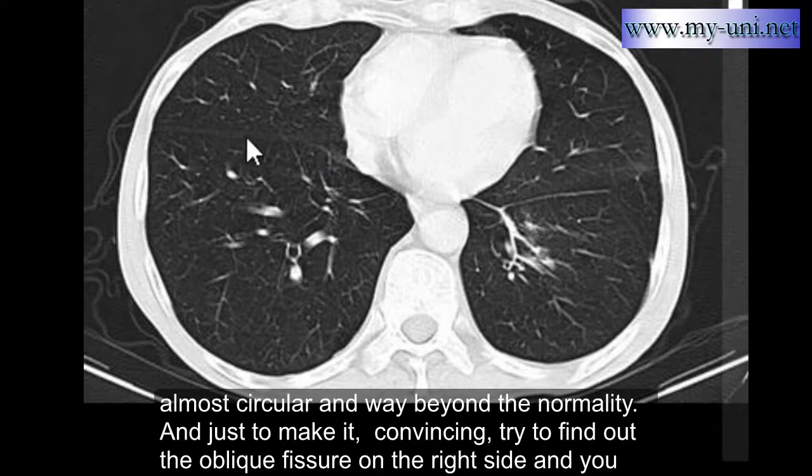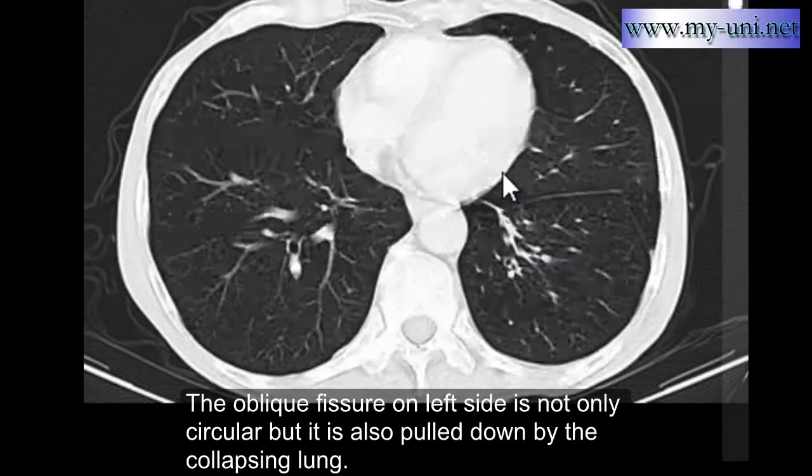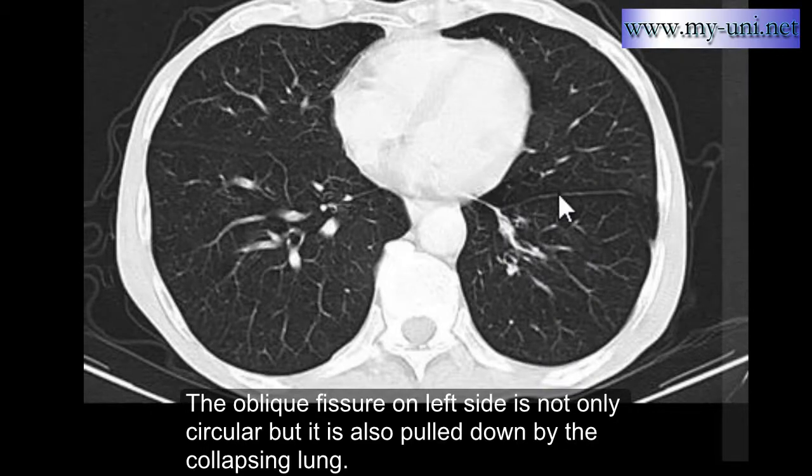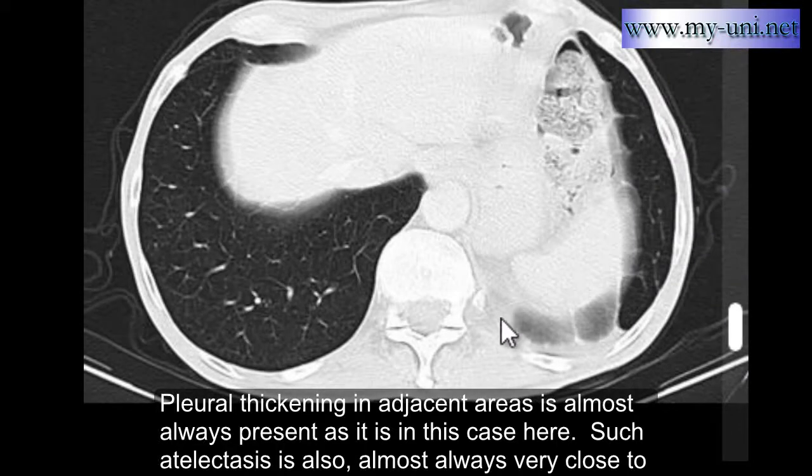You can see that it is higher up. The oblique fissure on the left side is not only circular, but it is also pulled down by the collapsing lung. Pleural thickening in adjacent areas is almost always present, as it is in this case here.